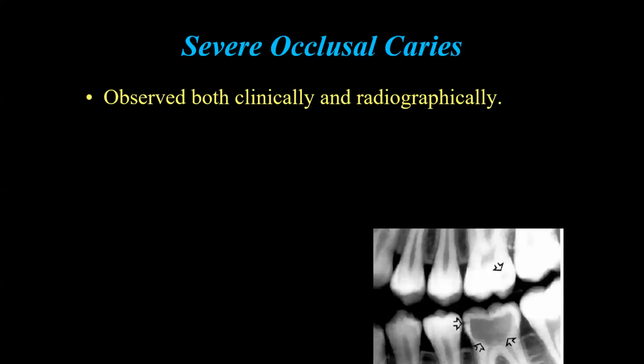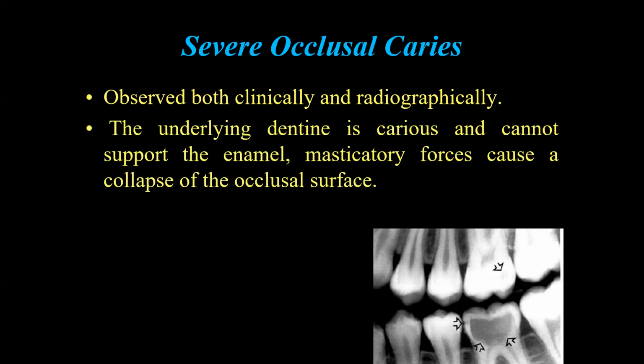Severe occlusal caries can be observed both clinically and radiographically. Previously, the incipient and the moderate ones sometimes could not be seen clinically either.